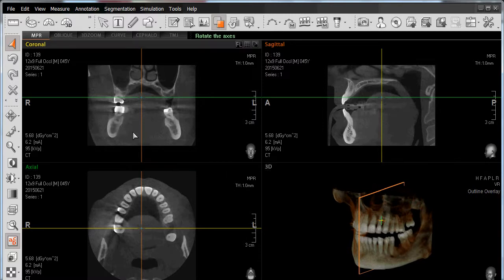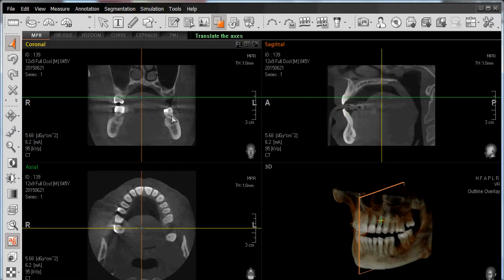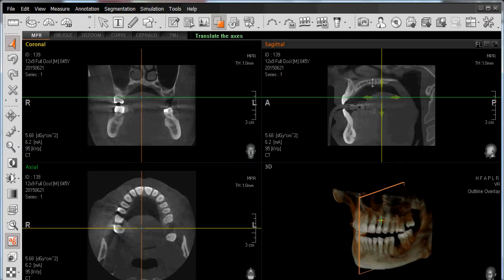In order to modify or navigate through these grayscale views, we'll start with our coronal view. Simply hover the mouse on top of the yellow line which identifies my coronal view, and note the large arrow projecting towards the coronal line. This is identifying the aspect of our view as it relates to this coronal window, as identified by the patient orientation in an anterior-posterior aspect.